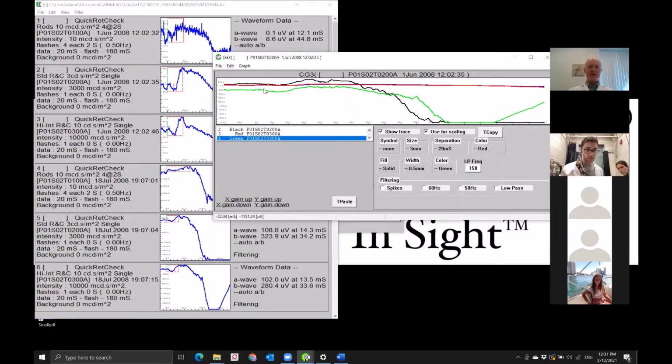Here, now I am in the scenario taking two different time sets. I'm overlaying the data, and when I start putting those over each other, I can see there is a significant difference between the sets of data. Normally, one waveform would look fairly close to the other, but you may see a reduction in the intensity or the timing may change. Those are the types of things that you would see over a period of time.